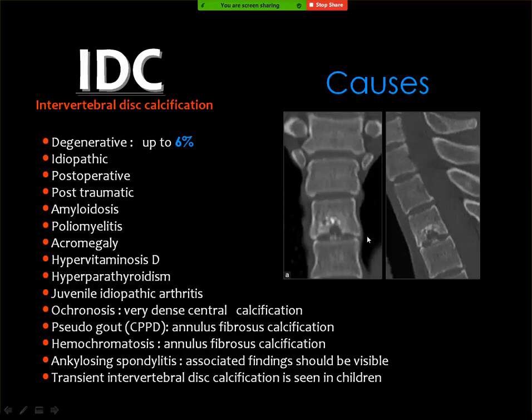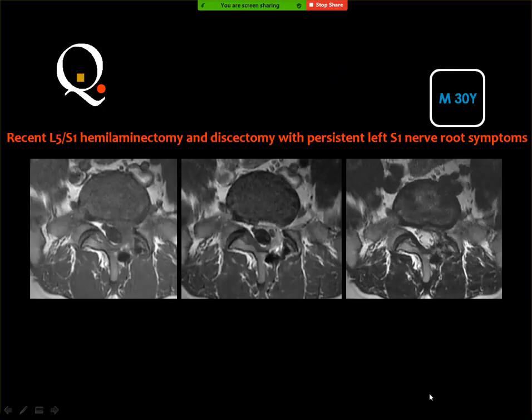Transient means that you got calcium in the disc that can be resolved after that.